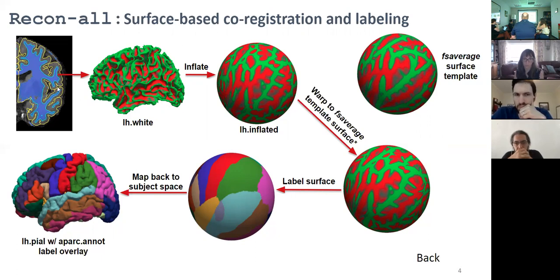So these individual sulci and gyri. If you have a sulcus here, like this big one, everybody know what this one is? This is the Sylvian fissure, a huge one, and then you have the interhemispheric fissure here, these big ones. And then you have other sulci that are prominent, like this one coming down here, the central sulcus. So you know that this is motor cortex here. This is somatosensory cortex here. And this is a nice, fairly consistent sulcus.